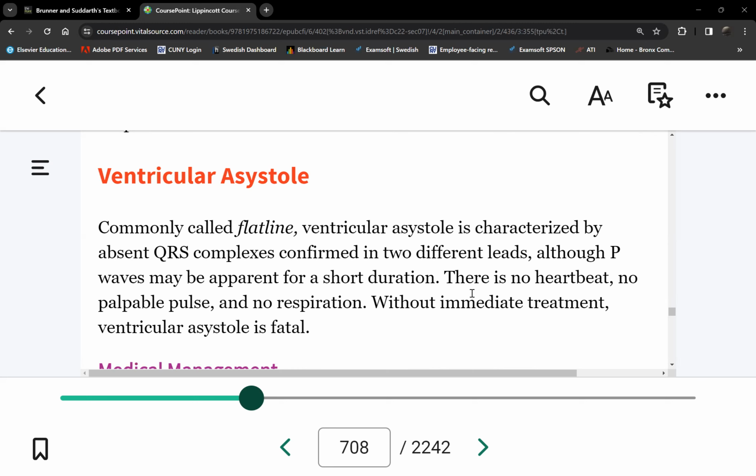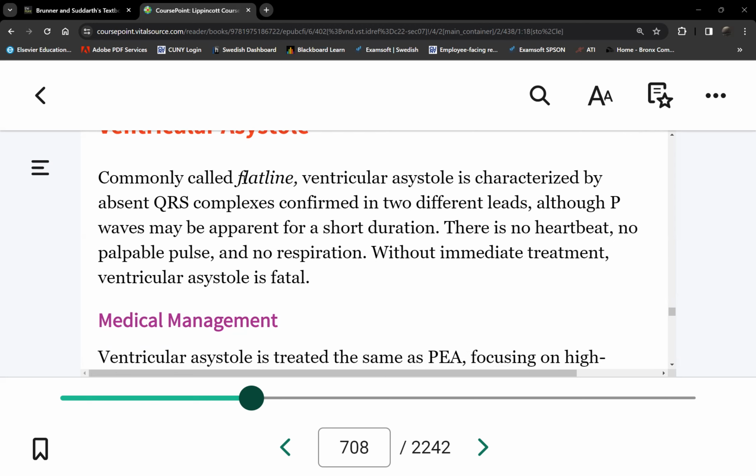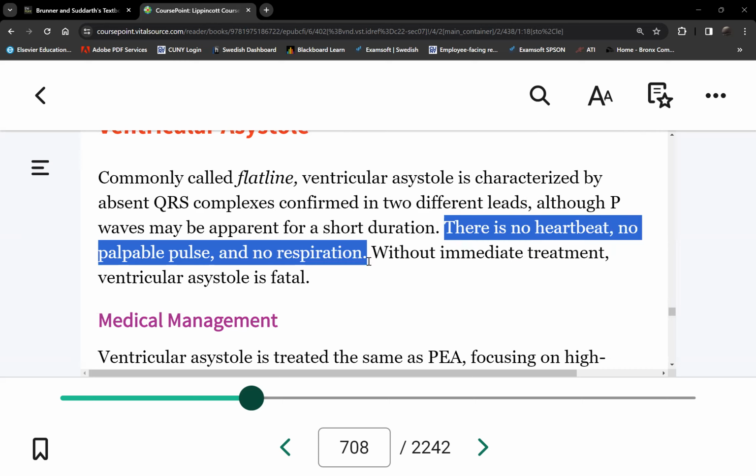Next, asystole. So this is very short since there is no electrical activity here whatsoever. So patients in flat line, so straight line. You may see a few bumps here and there, but that doesn't make it not asystole. It's still called asystole. So what's the only treatment here? Only chest compressions. Can we defibrillate? Why not? Is there a rhythm to defibrillate? No. So the only treatment is chest compressions.